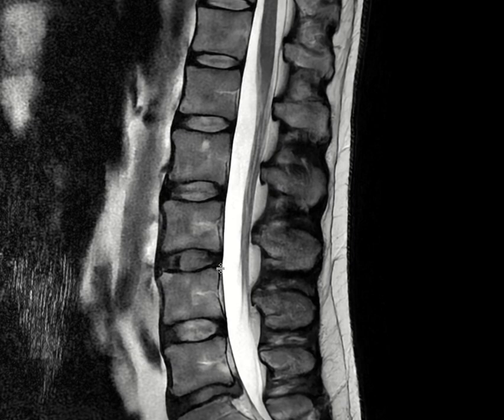You see that in this L3 in relation to L4, the posterior aspect is a little bit posteriorly positioned, but it's not that much, it's just very minimal. So first of all, you look for the alignment, then you look for the vertebral bodies. You make sure the vertebral body heights, as you see here, are all preserved, there is no fracture.